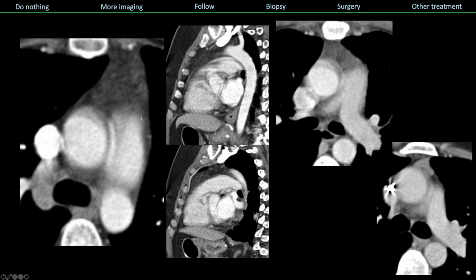The amount of fat within a thymus can vary based on the patient's age, or whether they've had a recent stressor. You can see this is some normal thymus, but it's got less fat than, say, this person on the left. Occasionally, you'll get a patient who's got some rebound thymus or residual thymus that doesn't have much fat, but is small and sort of spade or triangular shaped with concave borders. That usually doesn't worry me. I see this type of shape in the anterior mediastinum, and I'm automatically thinking it's probably just some benign thymic tissue. These are all do-nothing lesions.